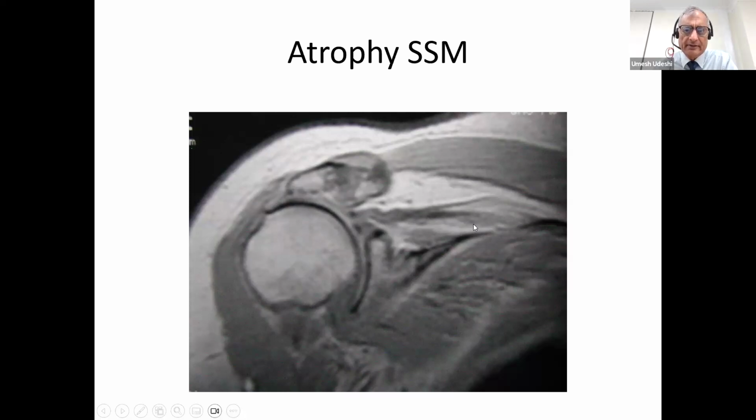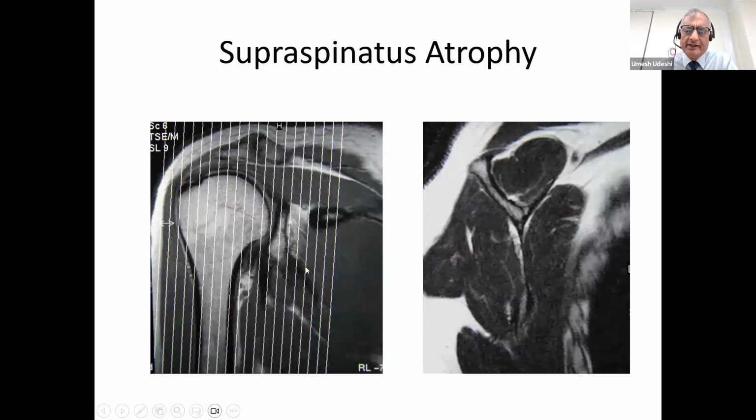And an atrophic supraspinatus muscle. Now, we need the radiographers to remember to take the sagittal slices all the way medially until they see this Y bony shape of the scapula. We want to see this Y because that's where the supraspinatus fossa should be full of supraspinatus muscle. It should look like this, nice and full of muscle with a bulging top surface. That's telling us that's a normal muscle, that's not atrophic or wasted away. And here are the rest of the muscles, subscapularis, infraspinatus, teres minor.